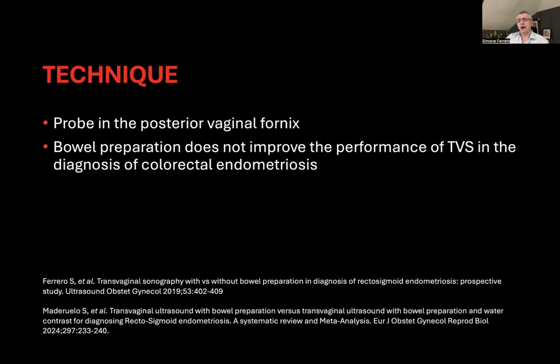Concerning the technique, obviously, it is performed by transvaginal ultrasonography. The probe must be placed in the posterior vaginal fornix, and it is well accepted that bowel preparation is not required before performing transvaginal ultrasonography for diagnosing rectosigmoid endometriosis.